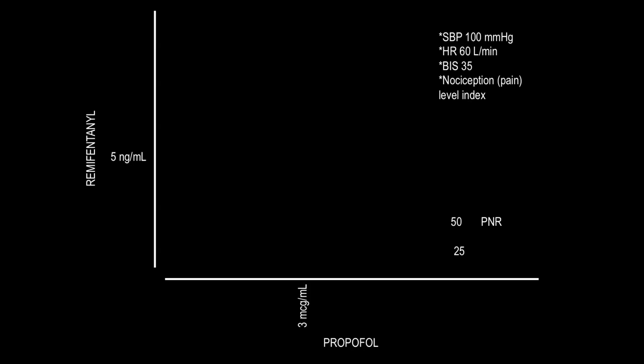The most modern software incorporates 2D graphics, where we can estimate the synergic interaction point of the concentration we have adjusted. This is a great advance because it is possible to know, with the information of the concentration of remifentanil and propofol, in which PNR curve the patient is.